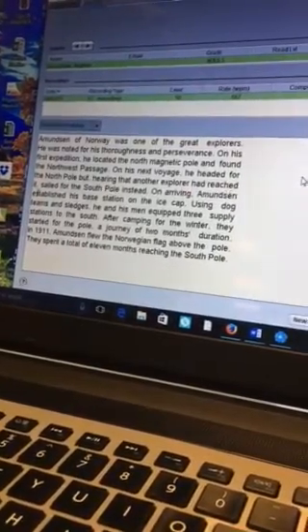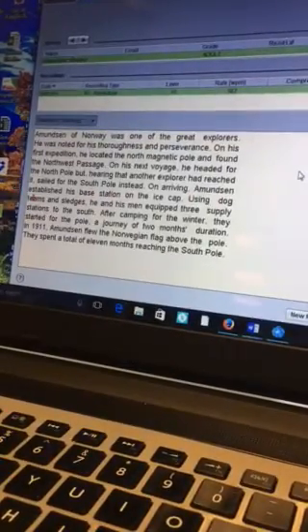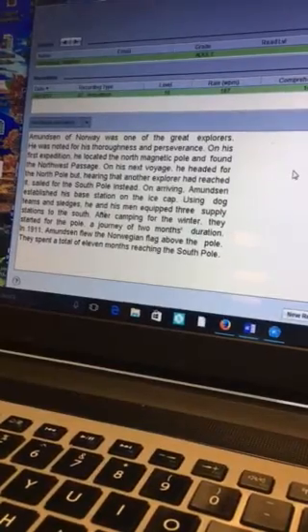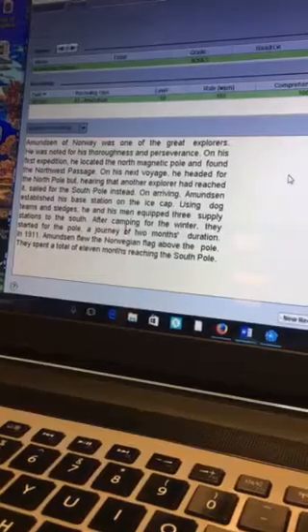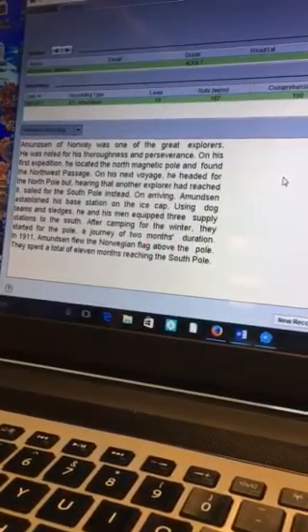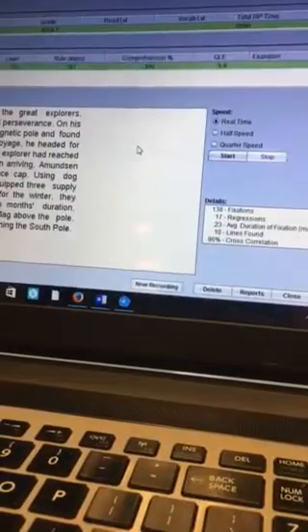When you're reading a word out of order in the sentence or perceiving letters in a word out of order, you're having to work much harder to figure out what the passage is saying. So there's a little bit of, again, back and forth and a little bit of inconsistency. So this is showing me that his eyes are having to work much harder than they should to go through the passage. Now what's impressive is your son still had 100% comprehension on this passage, which was excellent.